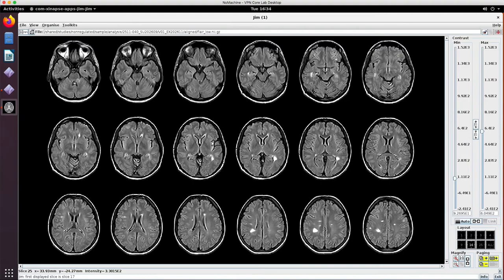In many cases, though, as MS proceeds, the lesions can become confluent. They can begin to have more diffuse edges and can start to run into each other, so that you'll see large complexes of lesions instead of a single lesion.